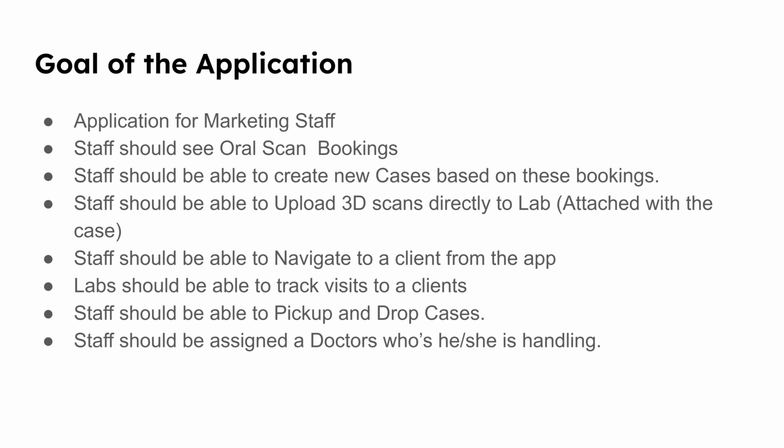And these marketing people should be able to go to the client, take the oral scan, and create a digital RX directly. Staff should be able to create cases based on the booking, the same thing that we discussed. Staff should be able to upload 3D scans directly. This will help you with managing the 3D files. A doctor can see the 3D file directly when a case is being created.